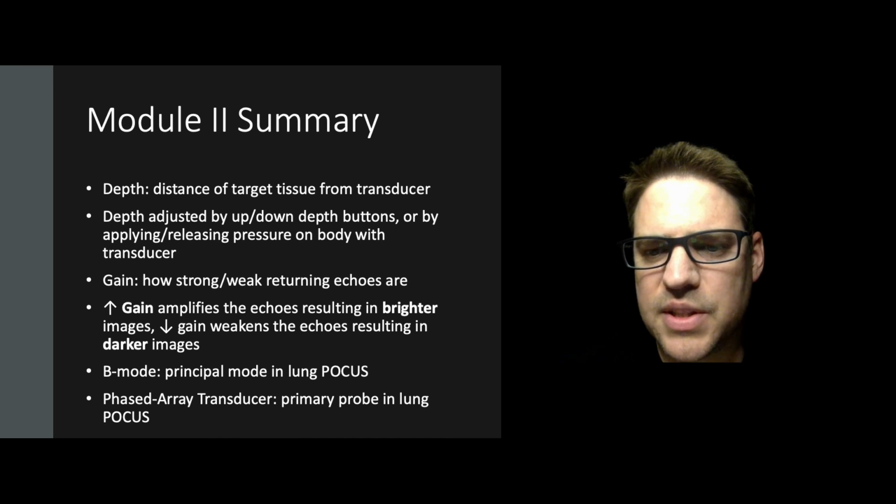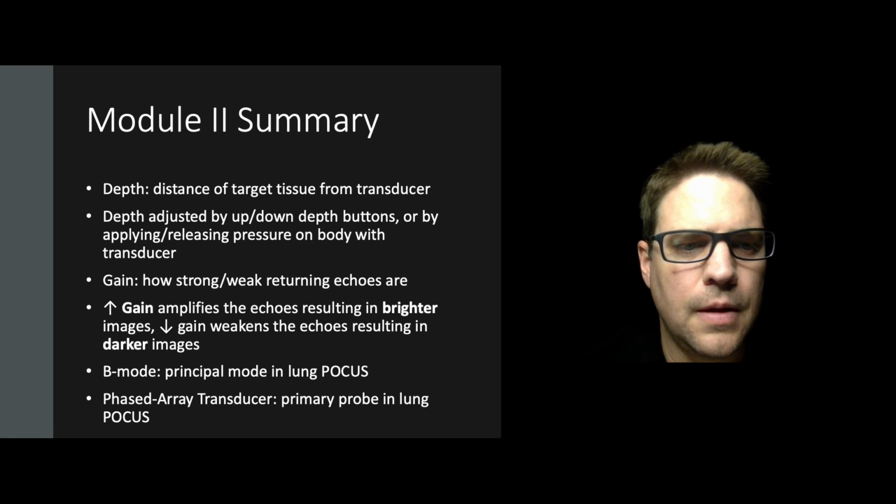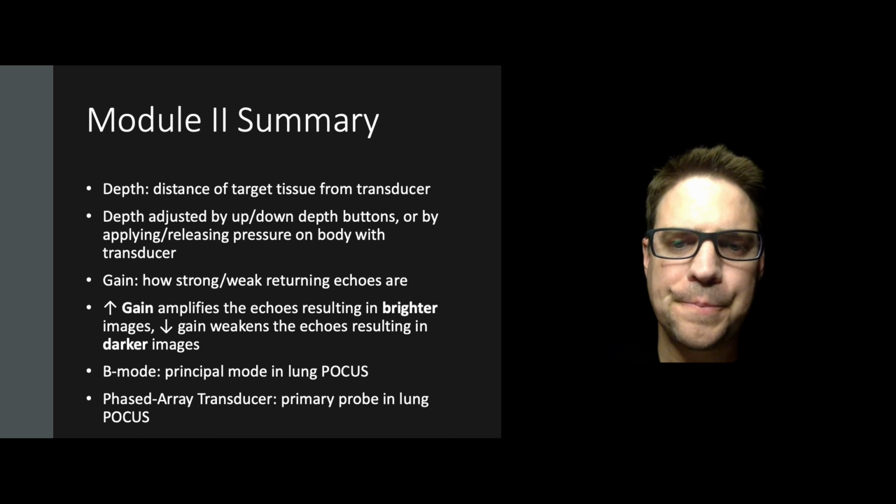B mode is the principal mode used in lung ultrasonography, and phased array transducers are the primary probe used in lung POCUS.